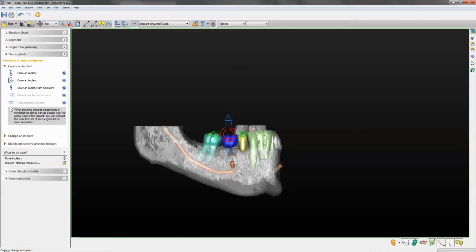Anything more than 3 teeth, I would highly recommend getting a laboratory to do a model wax-up and then scanning that in STL format, as well as providing an STL of the study cast as it is without any wax-up, and then you can import that into your project. For those stages, please look at the video tutorial on Optical Scan. For now, you should be able to go ahead and plan your implants.